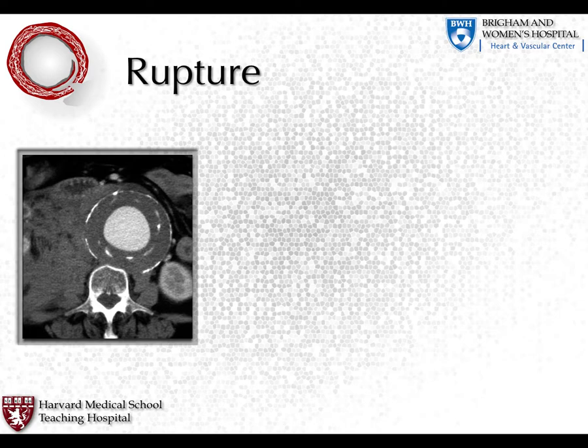Does that make sense? Yeah, but if the IMH is, you shouldn't see a large IMH in association with a penetrating ulcer. The long IMHs you see, those aren't ones with penetrating ulcers typically. Typically. There is an overlap. Yes. But there are those two patterns: the PAU pattern and then the IMH pattern, which just looks like a dissection, or thrombosed dissection, I suppose.